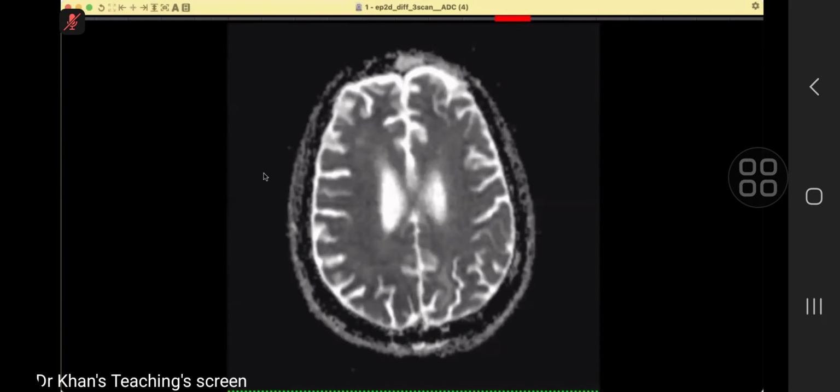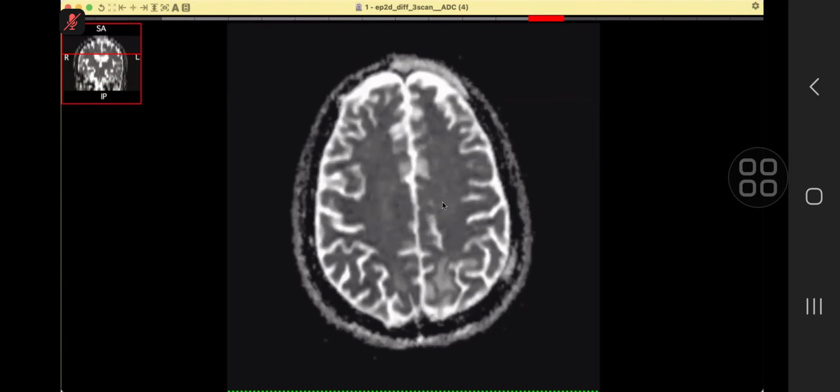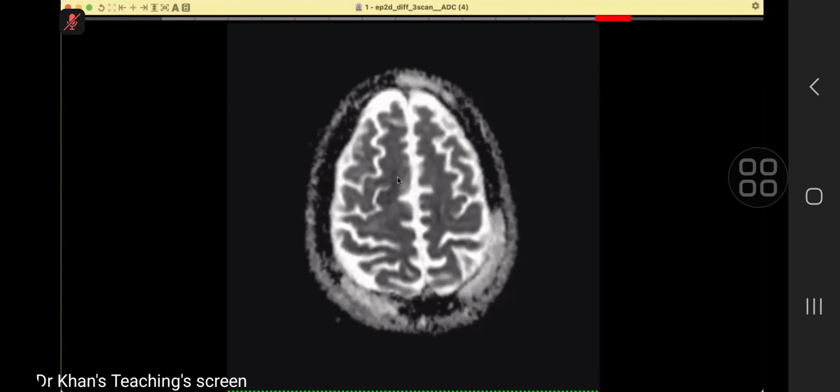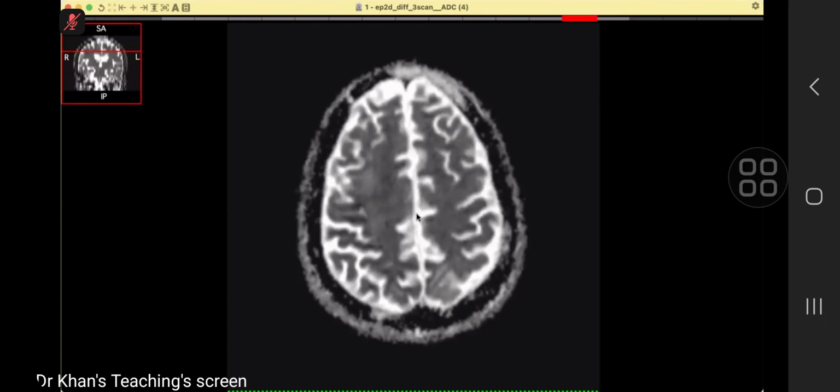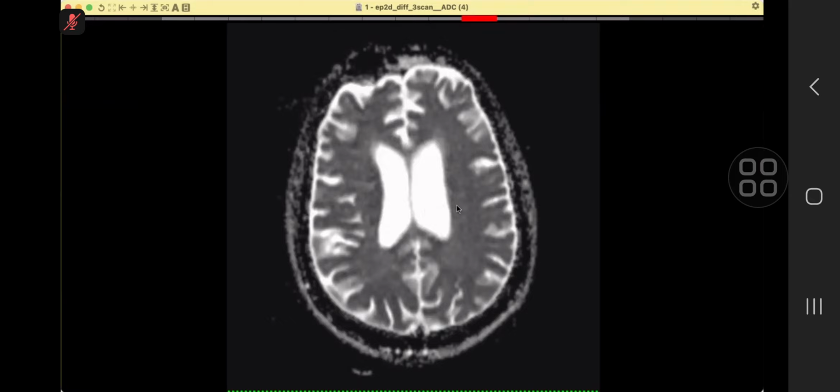Sir, this is the ADC. They are not restricting as such, so I can call it T2 shine through. Okay, so a bit of T2 shine through.